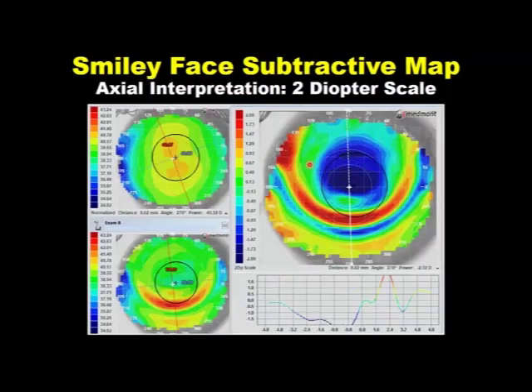Now the next and maybe most common adverse outcome from Ortho-K would be the smiley face. And this is one we see with great frequency. In practice, you would normally see about 80% of your cases come back in the first wear with bullseyes. The balance of the 20 are usually smiley face outcomes. A very small amount might be central island, but most of them are smiley face.